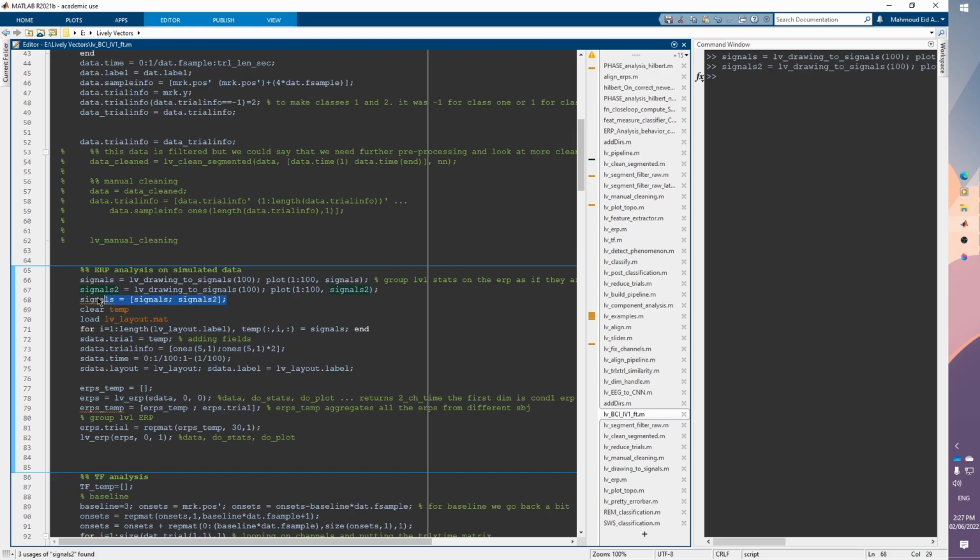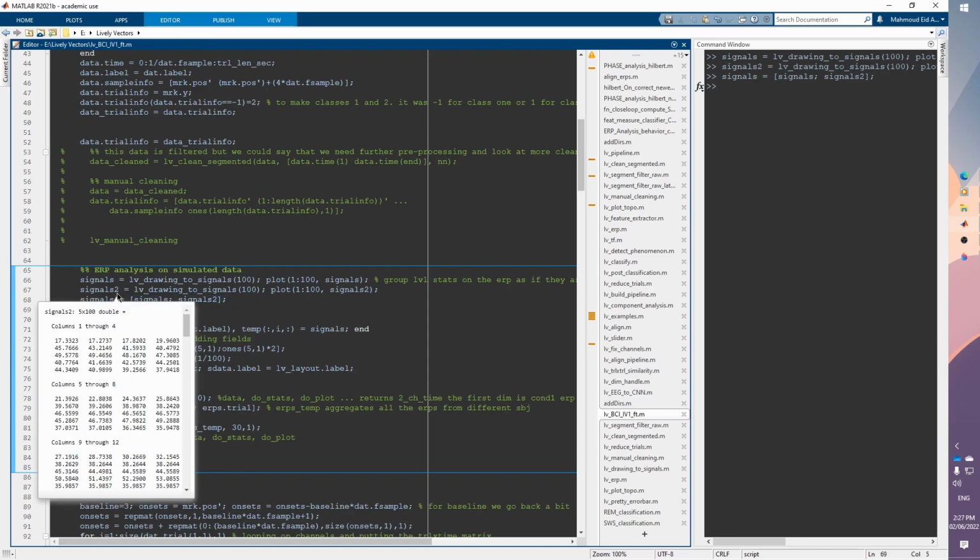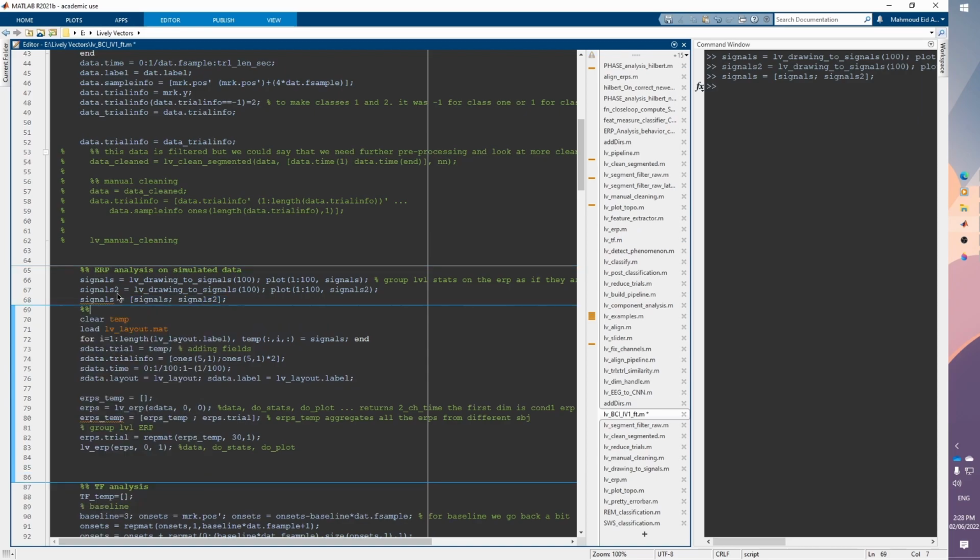Right now I'm aggregating all my signals here. So signals here is aggregated and ready. I'm gonna put this in a different cell such that I only run this part. I'm gonna place a breakpoint, and I'm gonna press F4 to run this block, or Control Enter, and then we can step together and see how to trace such code.